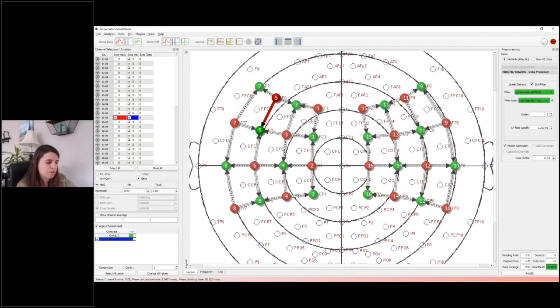And this will be critical for neurofeedback because you generally focus on a couple of channels. So you want to make sure that you're using a channel for your classification or your neurofeedback that is of high quality. You'll also see, if heartbeat is detected, this heart symbol in the channel. In the list, you'll also see the actual heart rate value down here in the bottom right corner.